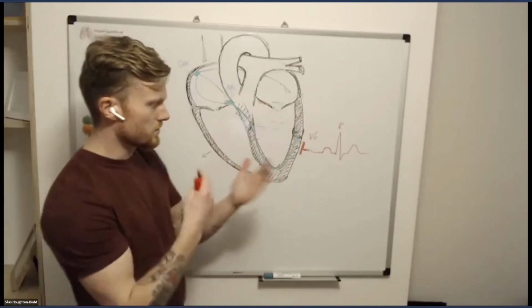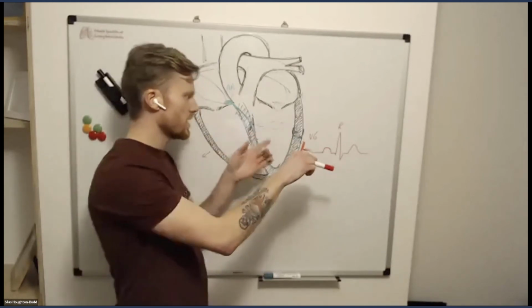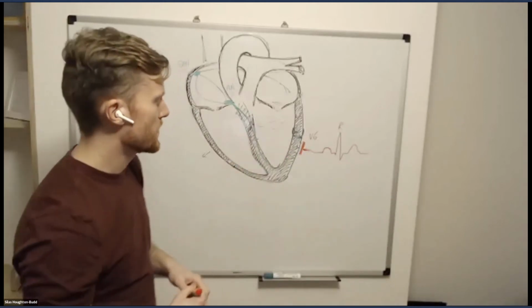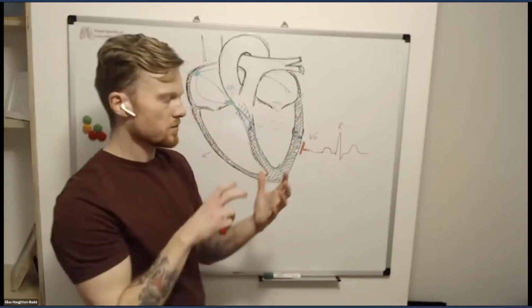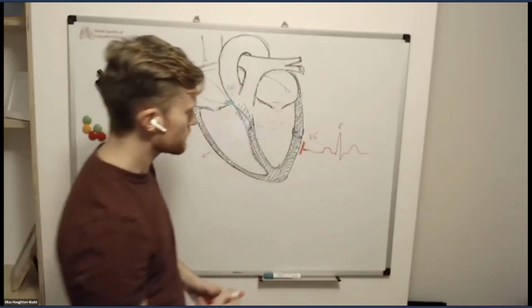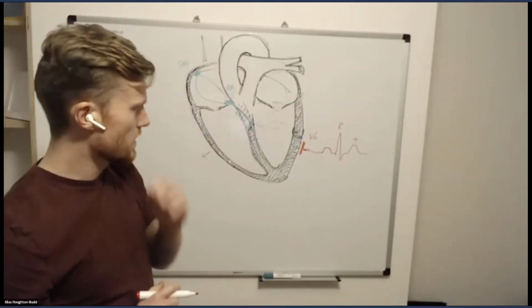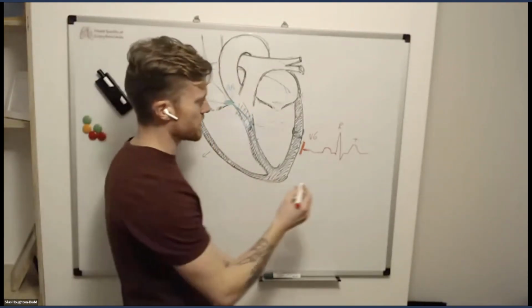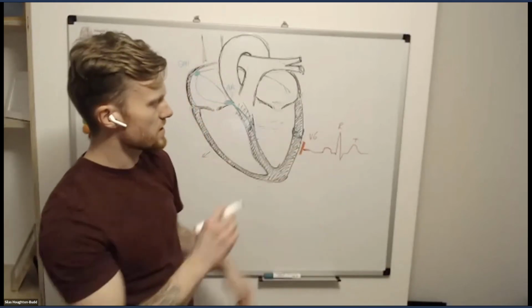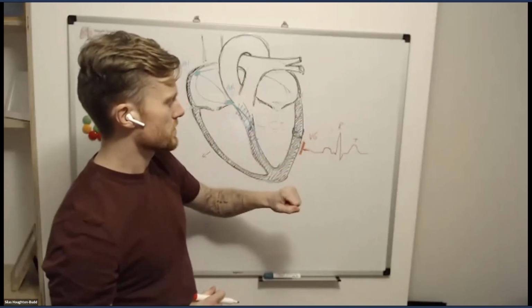And so what we have is a kind of double negative, where the depolarization wave flows towards the electrode and the repolarization wave flows away from the electrode. And so we get a double negative and an overall positive T wave, which is termed concordant. And concordant is an important term. That means the T wave is in the same overall direction as the majority of the QRS complex.